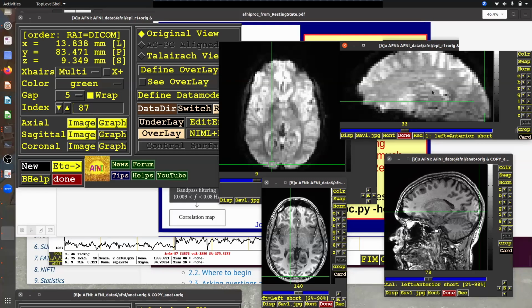But since everyone's brain is a slightly different shape and has different features, what we're going to do is take this and mush it around to a standard template brain. In that way, we'll be able to click on one spot and everyone's motor cortex should be there. If I just took this volume and everyone else's brain scan here, because some brains are a little bit taller, shorter, narrower, different shapes, it wouldn't work to match up features. So that's essentially what we want to do with that spatial normalization.